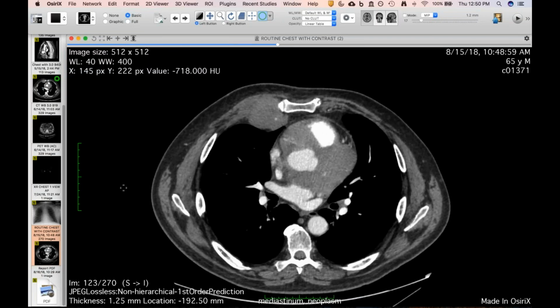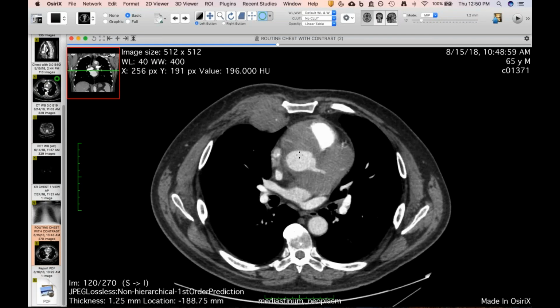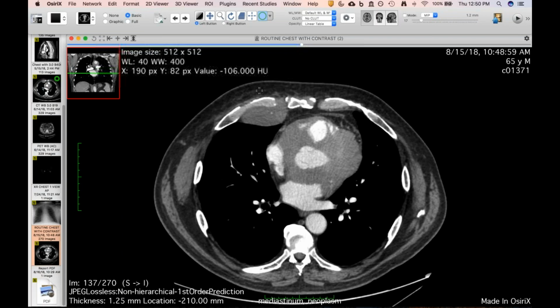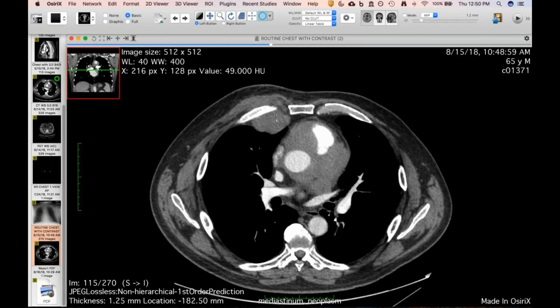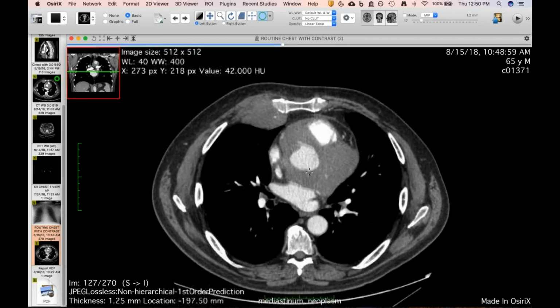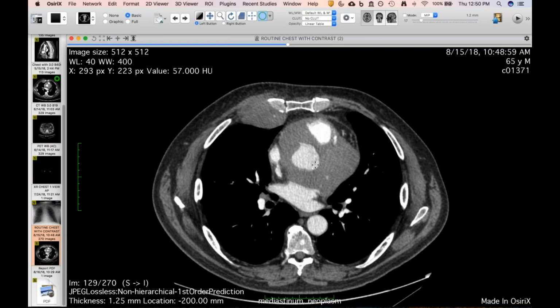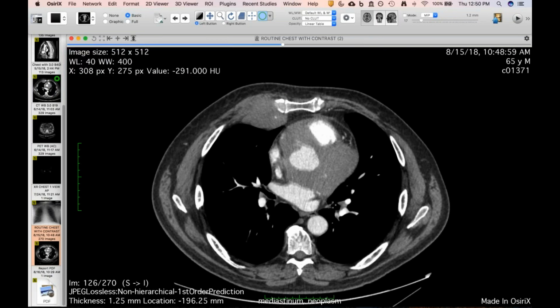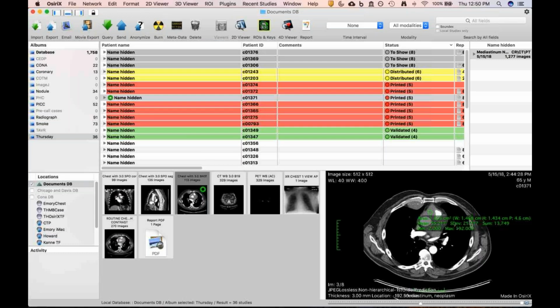By the way, this was a follow-up CT that was done yesterday, and it's still pretty similar, other than the surgical appearance from them doing an excisional biopsy in this area. So it really hasn't progressed that much in a couple months, but I still don't think that dissuades me from this being potentially lymphoma. So, a curious one.